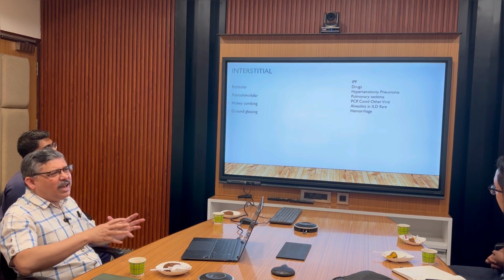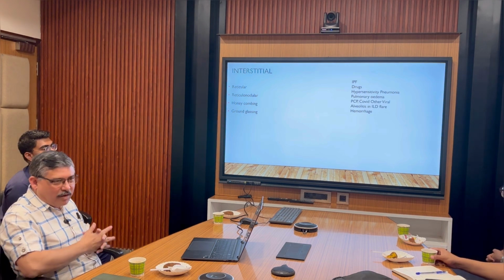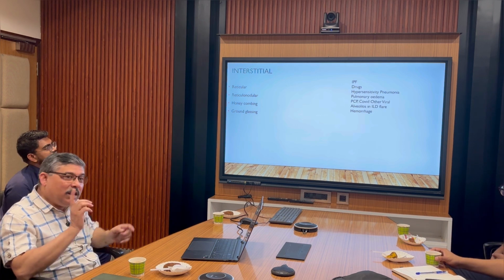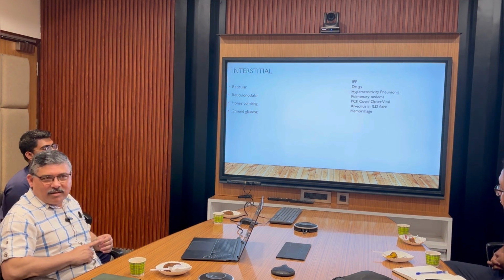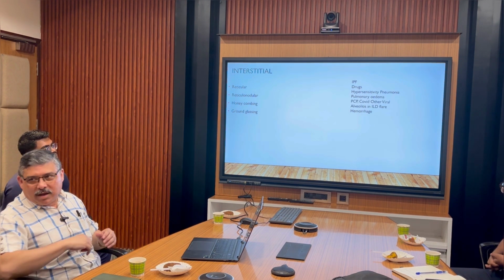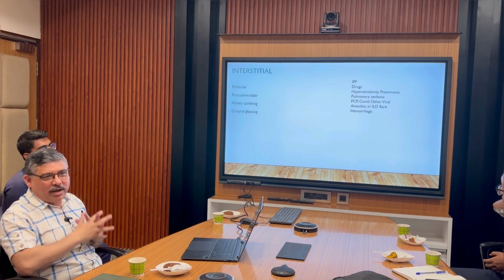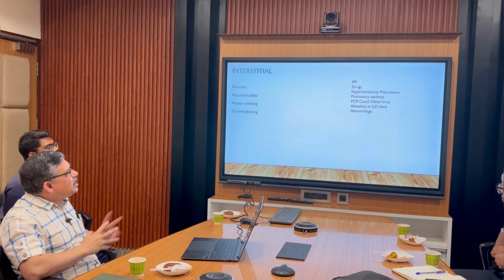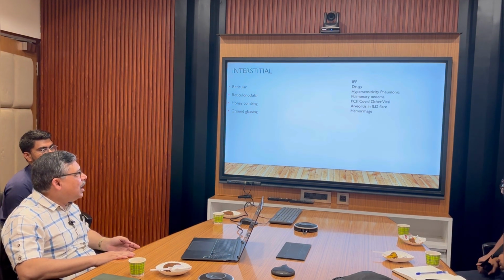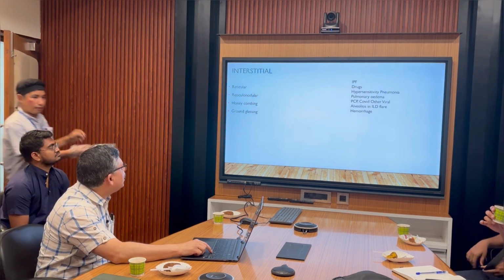I will not go into detail about interstitial lung disease and other things, because we are discussing X-rays, not the disease itself. So there are so many things that can cause interstitial shadows. Pulmonary edema is also one, okay. Pulmonary edema initially will come with only interstitial edema. So there also you will find fine reticular shadowing, okay. So that is why an example of pulmonary edema is there. COVID is another example. Alveolitis and hemorrhage inside the alveoli. So these can cause interstitial shadows.